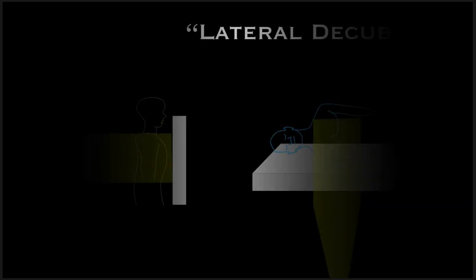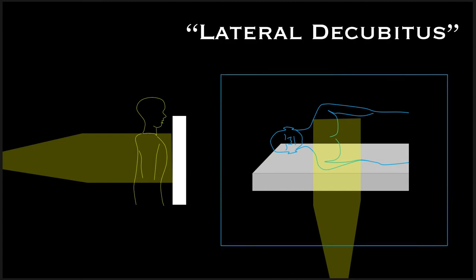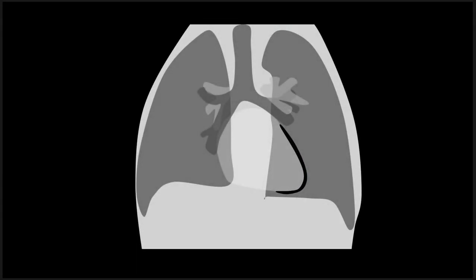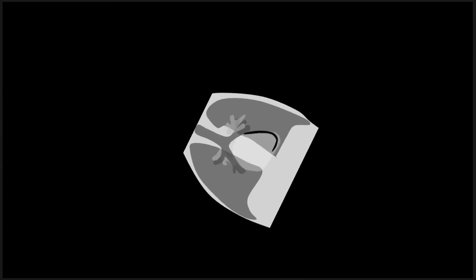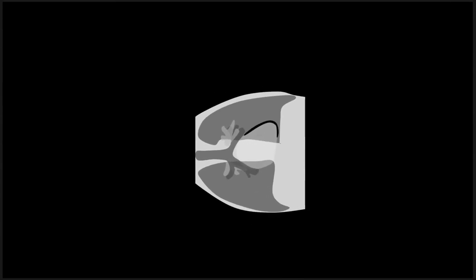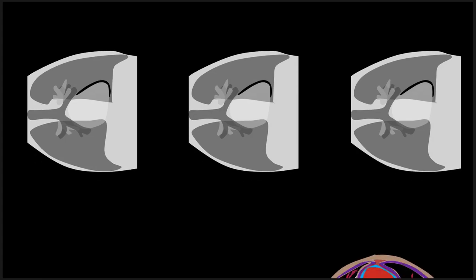Well, we can dig into our bag of tricks, and we can use this thing here, the lateral decubitus. We've mentioned this in a couple of talks here, I think most recently with our air trapping lecture. So we're going to break this out again to use it for some problem solving. So here's our black line right there. Now let's see what happens when we start turning the patient around. I've got 3 different scenarios here, depending on the etiology.